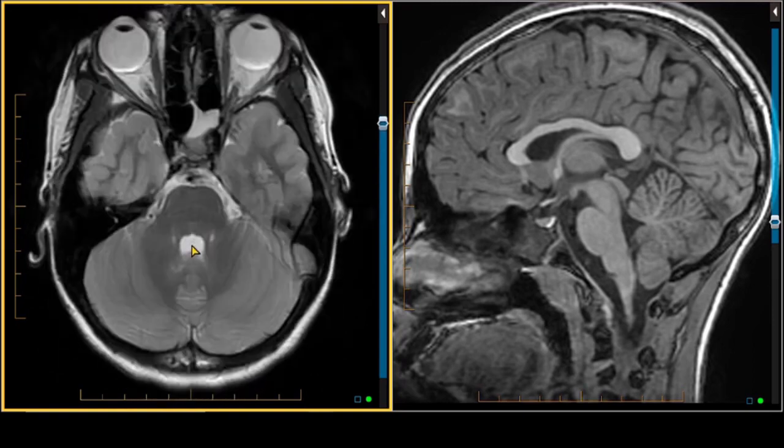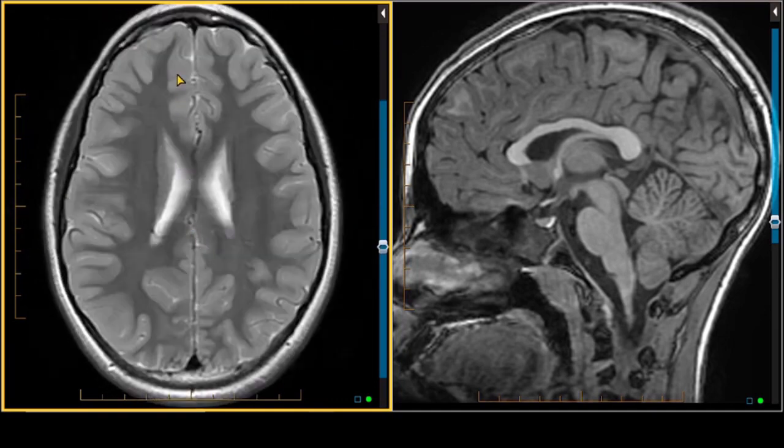Third ventricle, fourth ventricle. At this age, we're seeing near complete to complete myelination, where on T2 weighted imaging, everything looks hypointense for the myelinated white matter. By 9.5 years old, the only white matter which is unmyelinated is very subtle peripheral juxtacortical connections in the frontal lobes, which is typically below the ability to detect on MR imaging. So everything looks fairly normal.